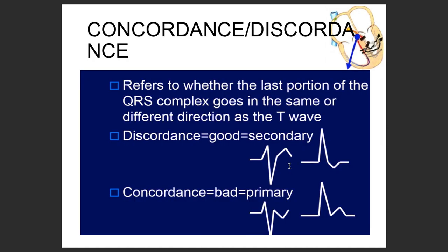Now, examples. Examples are always the best thing. This is what is always important for me, to go through those examples. So you can see some examples in this. As I was telling you, you see the QRS and the T wave. Everyone can see it, right? Yes, wonderful. So what is happening is, the QRS is positive, T wave is negative.